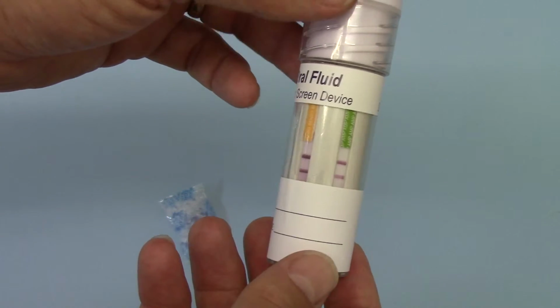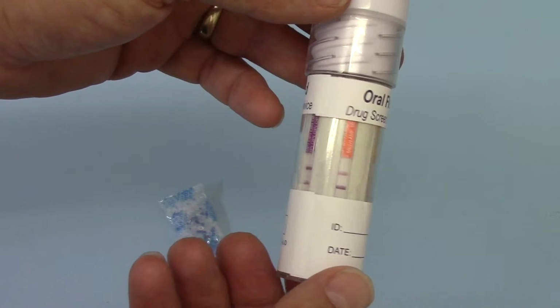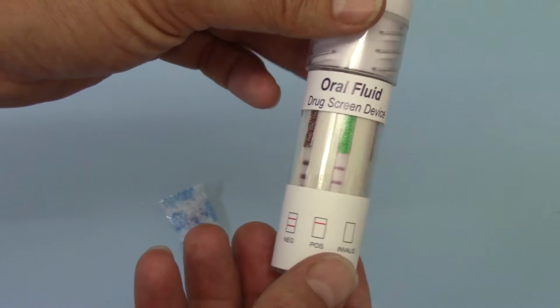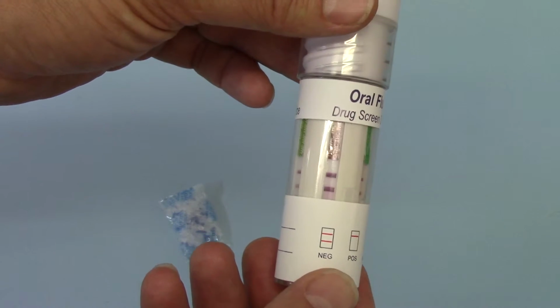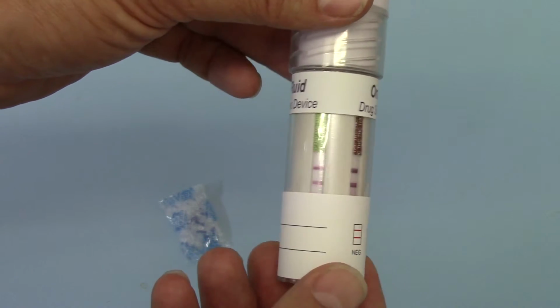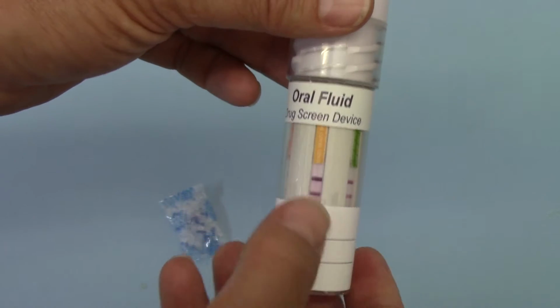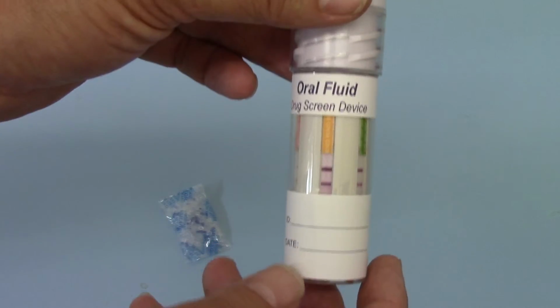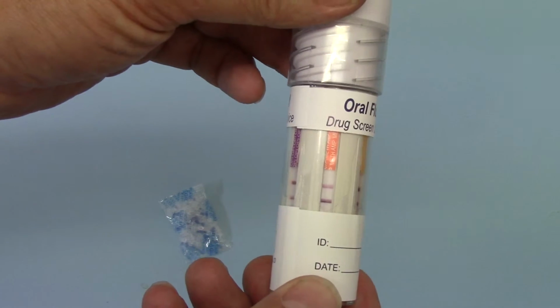Now, if any of these tests had detected drugs in the saliva sample, you would have a control line showing, but no decipherable or even a faint test line showing at all at the 10-minute read time. If you don't get the control lines forming at the top of these test panels nearest the coding on the test strips, that is an invalid test.